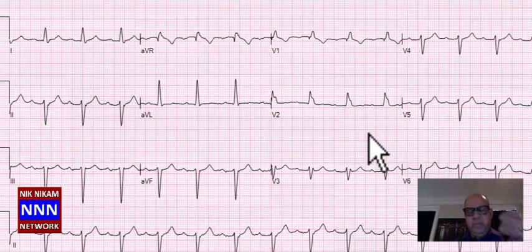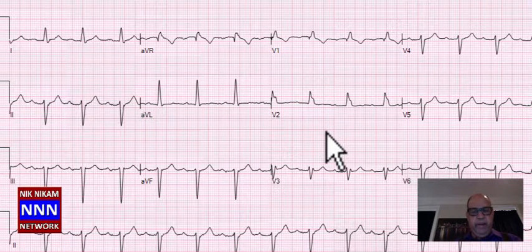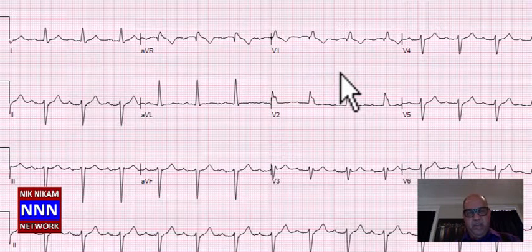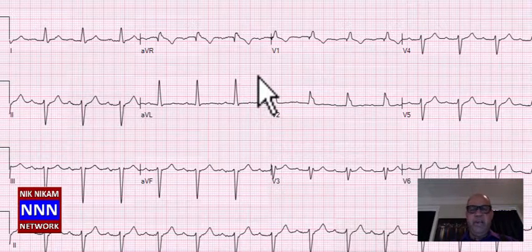So these are some of the things you need to start thinking, and then examine the patient and see which criteria best fit what we find on the electrocardiogram. Electrocardiogram is just a representation of what we are seeing, and we need to use these findings in the context of a bedside examination of the patient along with other diagnostic tests like chest x-ray, echocardiogram, to really pinpoint how all the findings on the electrocardiogram fit with what is actually happening inside the patient's body.